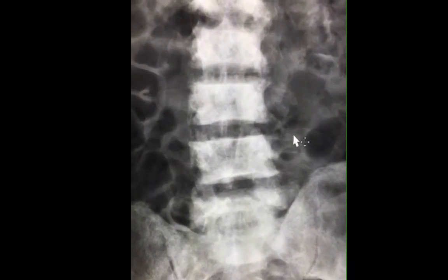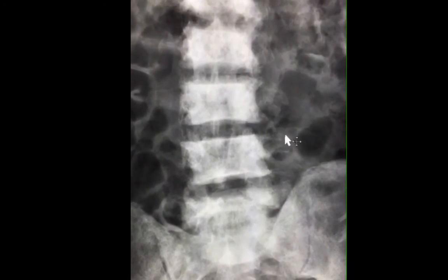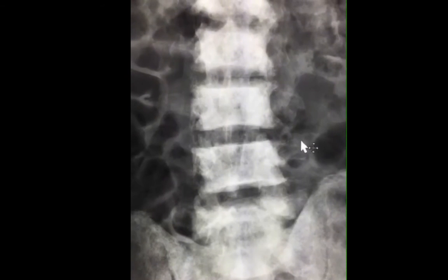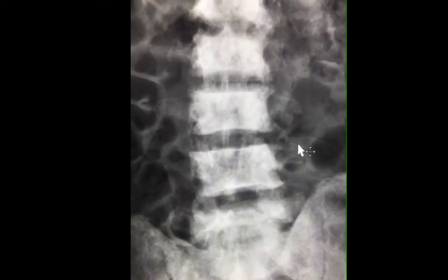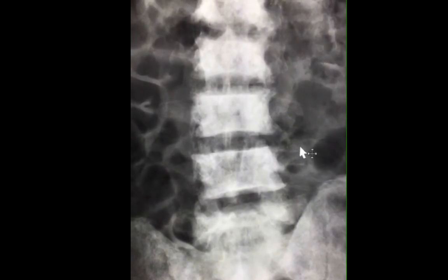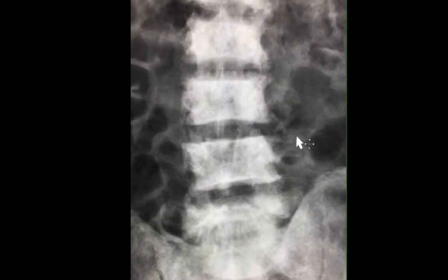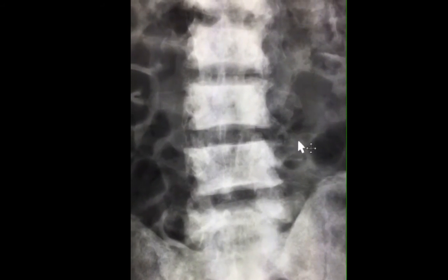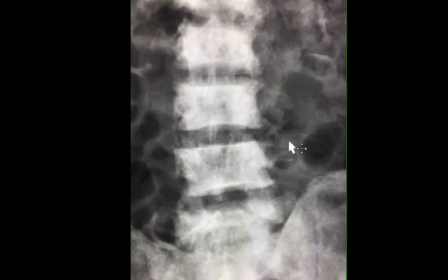Now, as we mentioned, some of these entities may be very rare, not that important, and some of them might not exactly look like diffuse osteosclerosis. Although Paget's disease, for example, could give you increased density, it's characterized by cortical thickening, bone expansion and coarse trabeculations, which we don't see here. Pycnodysostosis is a very rare entity that could be seen in a pediatric or adolescent population. Osteopetrosis is another pediatric entity that is not seen in adults.